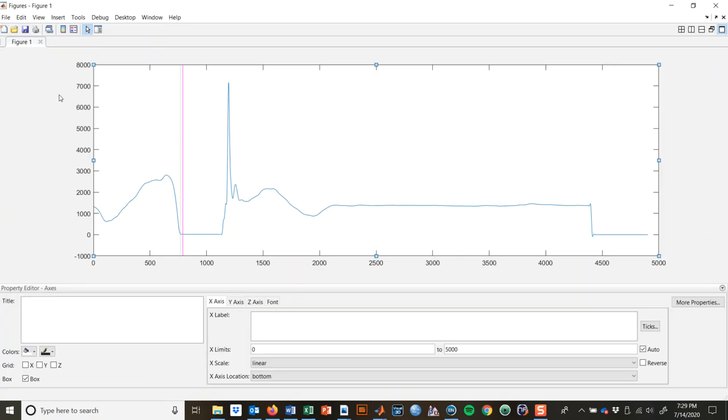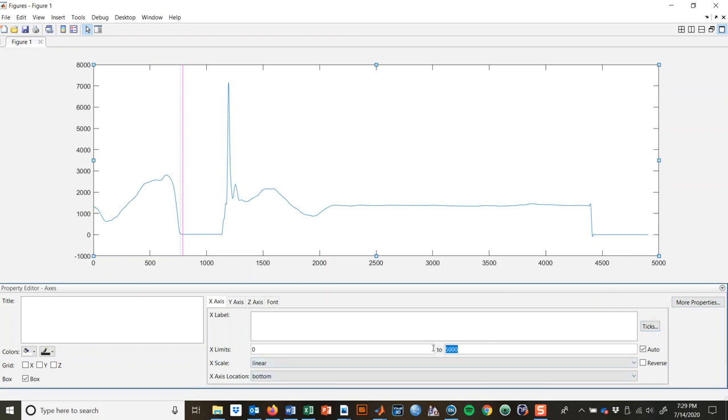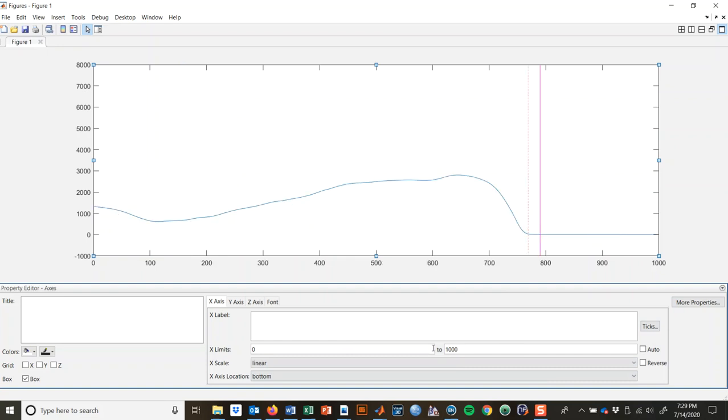Let's actually do a little inspection. No, but you notice they do come out a little different. Now, one thing to think about is if I go here and I crop this x-axis to about 1000, and you look at that and you'll say, ooh, well, this new takeoff method might actually not be ideal.